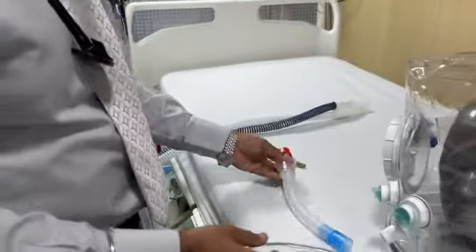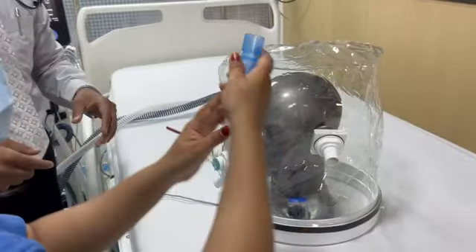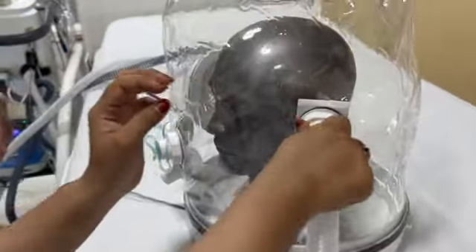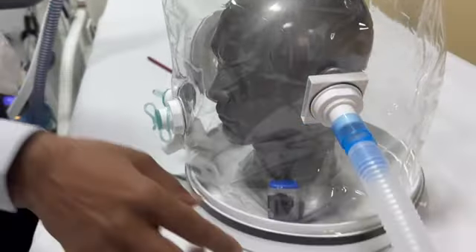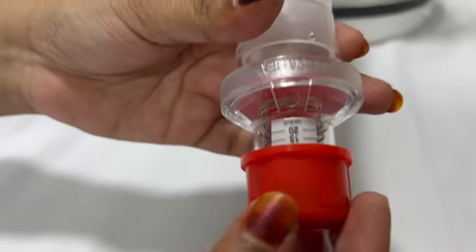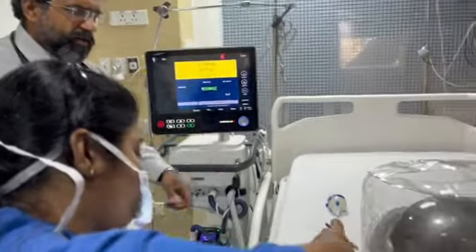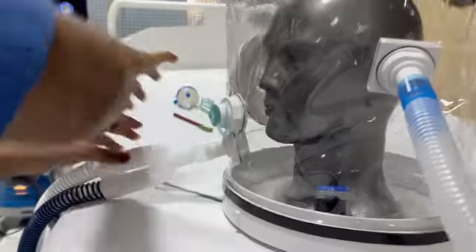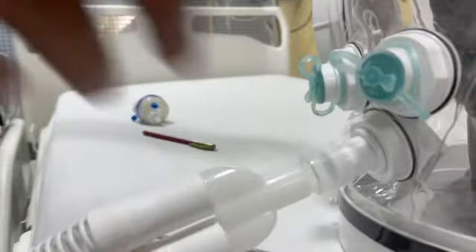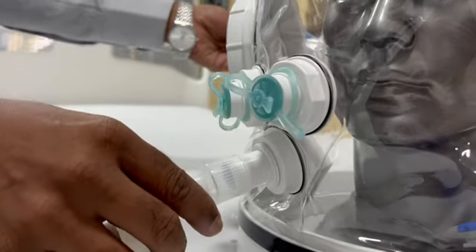And what I will do now here is, we will have to remove one of the sides. So we've removed one of the sides and attached the PEEP valve over there, and as I said, the PEEP has to be dialed at 10. So let's dial the PEEP at 10. We dial the PEEP at 10, leave it over there, and what we do is we attach one side of the circuit to the high flow. Here, we have stopped one port. One is attached to the high flow, and that is the PEEP.